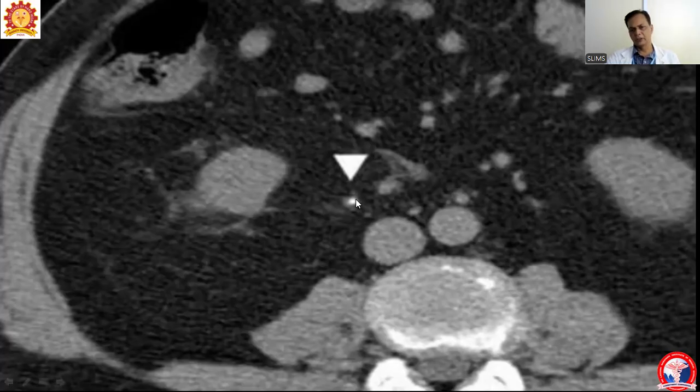What is an additional sign here is the ureter. It is normally a thin structure, but when it gets obstructed it causes inflammation of the ureter wall, and this edematous wall around the calculus is seen. In symptomatic patients of ureteric calculus, when the wall around the obstructing calculus shows a hollow kind of soft tissue thing, that represents edematous changes in the adjacent ureteral wall. This is one of the important signs, very helpful in diagnosing small, obstructed calculi.